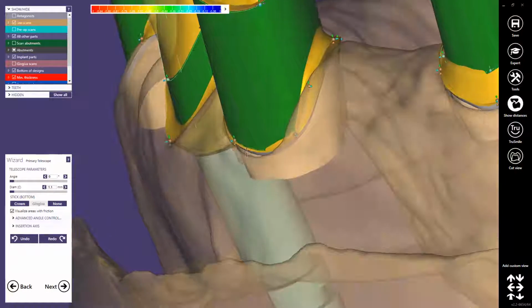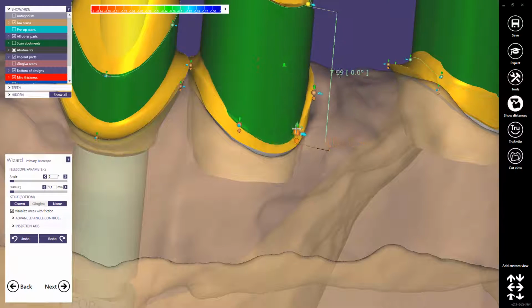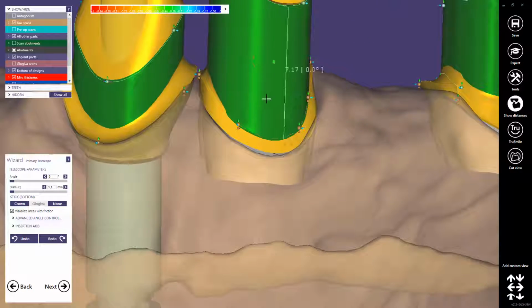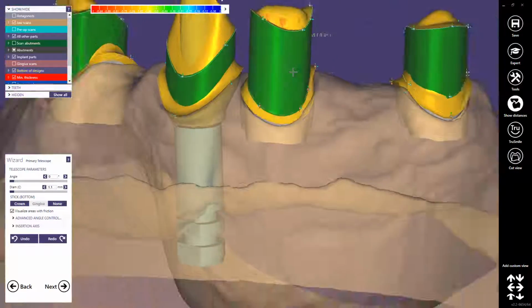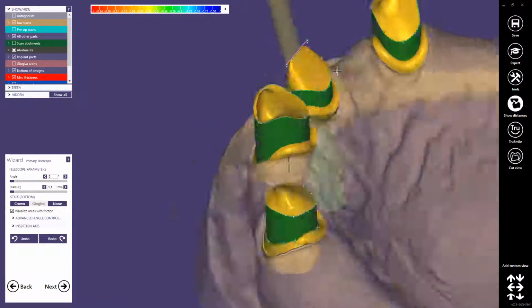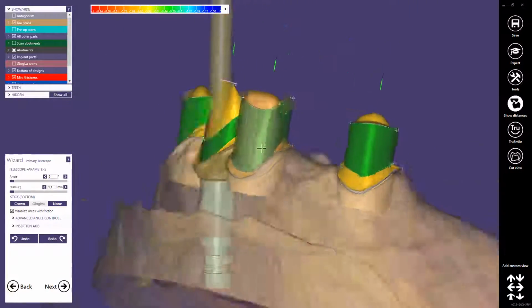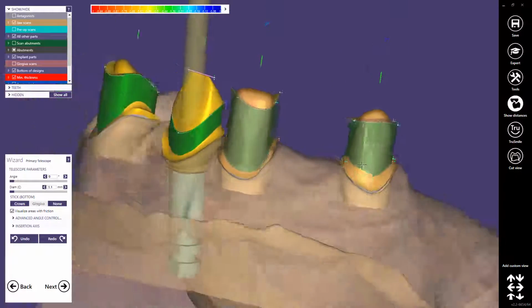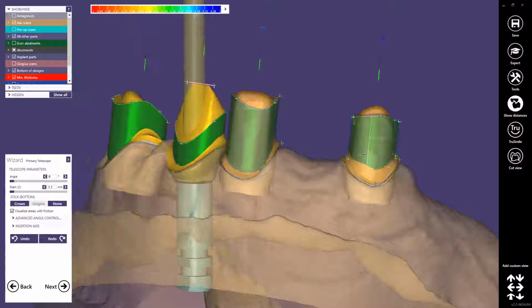Okay, let's do it again here with the standard technique. Just move those parts inwards. You see, this here is much easier, but in some cases the option with two friction areas can have some advantages. Yeah, check always with some transparency with Shift and the mouse wheel if they are as thin as possible here in the lower region.